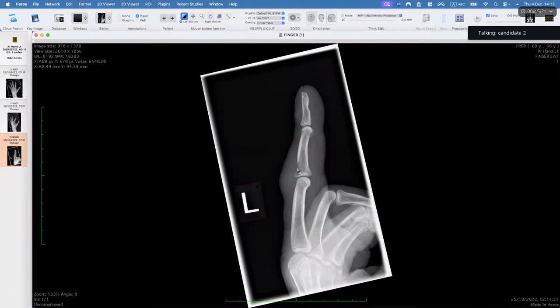density present at the level of the proximal interphalangeal joint of the little finger, which is probably long standing because I can see some kind of scalloping along the dorsal aspect of the middle phalanx. I cannot see any calcifications or any differential densities at this site. So to further evaluate it, I would like to go ahead with an MRI of this patient.